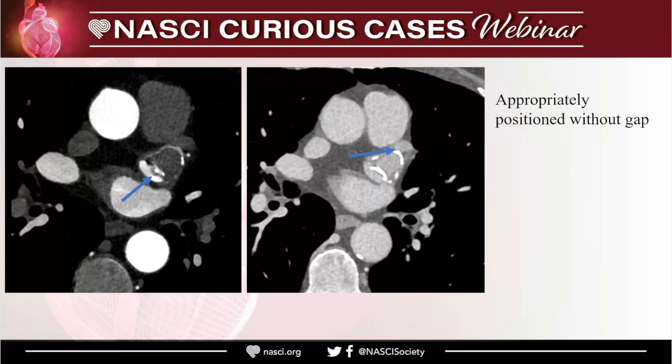When it is more than 6 months, suppose 1 year, you can say there is opacification with inconclusive peri-device leak. You do not see a device leak, but it is inconclusive. So it may be an inconclusive peri-device leak, or it may be incomplete endothelialization.